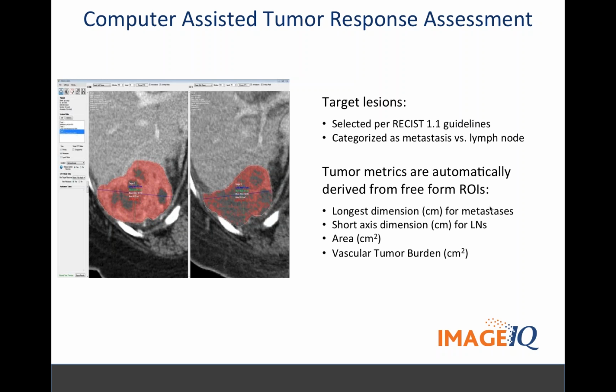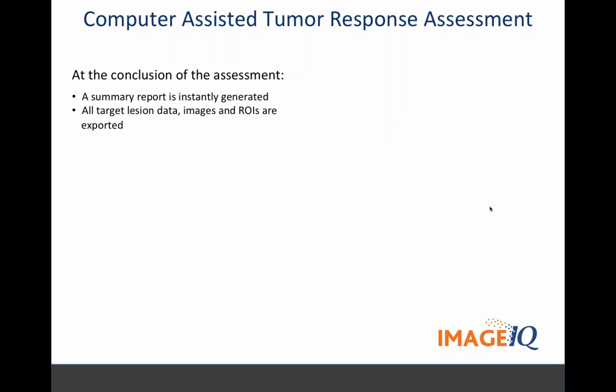That's something proprietary that we have created that's unique to us, very useful for anti-angiogenic therapies, really all targeted agents, including the immune response agents. We think this is going to be very useful for that. And what I'm not showing you is you can calculate thousands of different CT texture analysis parameters off of this as well, which can be very useful in a research setting. So that's quite a bit of different things that we can do.